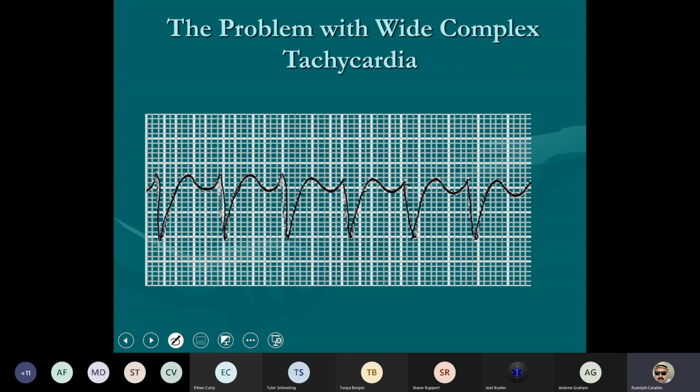Or does that freak some people out and they don't know what to look at? Yeah, it's got me confused. Okay, let's talk through it, because you will have different rhythms that'll freak you out a little bit like this.